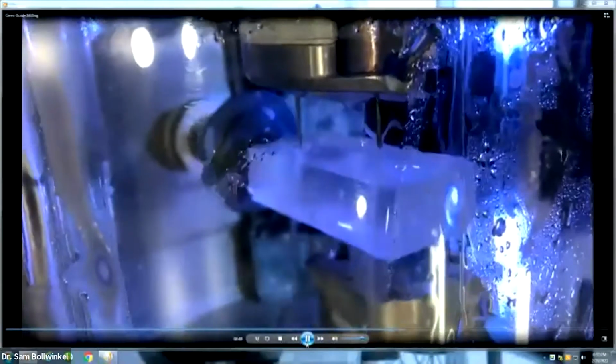We get a lot of questions. Well, I hear the sound's horrible. You should see the difference between the door being open and the door being closed. So we have a soundproof booth coming down now. And literally, this is right outside my hygiene department at my office. So with the shield down, very, very quiet as far as the decibels and everything else goes.